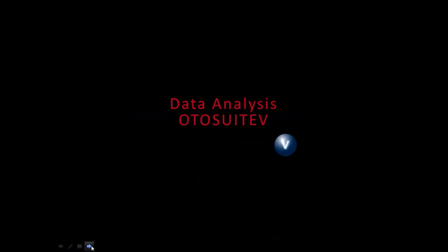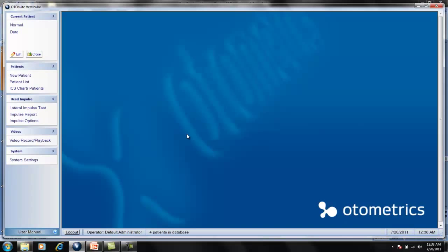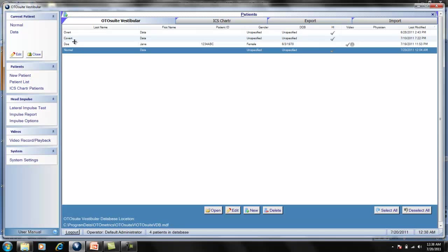Let's talk some more about data analysis in the ICS impulse device. Okay, let's go in the software. Click on Patient List, and what you'll see is you have 3 demo data: a normal example, a covert, and an overt example. And these are the ones we just talked about, but I want to show you where you can access the 2D and 3D graphs in your software. So if you open up one of these patients, let's go to Overt.